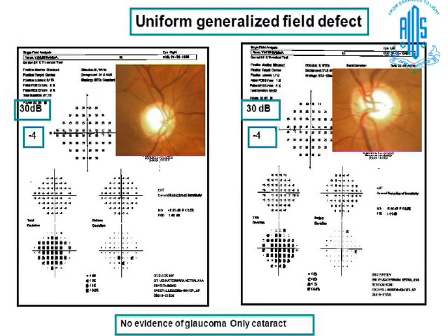So to identify this localized scotoma which developed in generalized depression, the pattern deviation probability plots are created. How they are created, I wrote in the book: the seventh best point. They identify the seventh best point, and the retinal sensitivity that converts the seventh best point to 0 is added to all the points. That means we are removing the generalized depression, the value of the seventh best point.